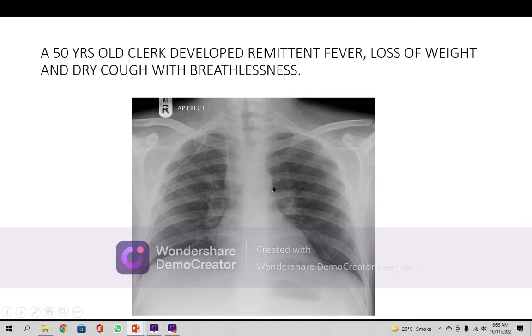Now, the upper part of the middle mediastinum is this one. Now look, this is the first part, this is second and third, and this is the fourth one. Here is the aortic knuckle. This is the trachea. Always remember, on the right side of the trachea you see a linear shadow going up, from here to here. This linear shadow is a paratracheal lymphadenopathy in this condition. Although this patient may show cervical lymph nodes which are missed in the scenario, and the hila are prominent, although not enlarged. But the main thing is the paratracheal lymphadenopathy.